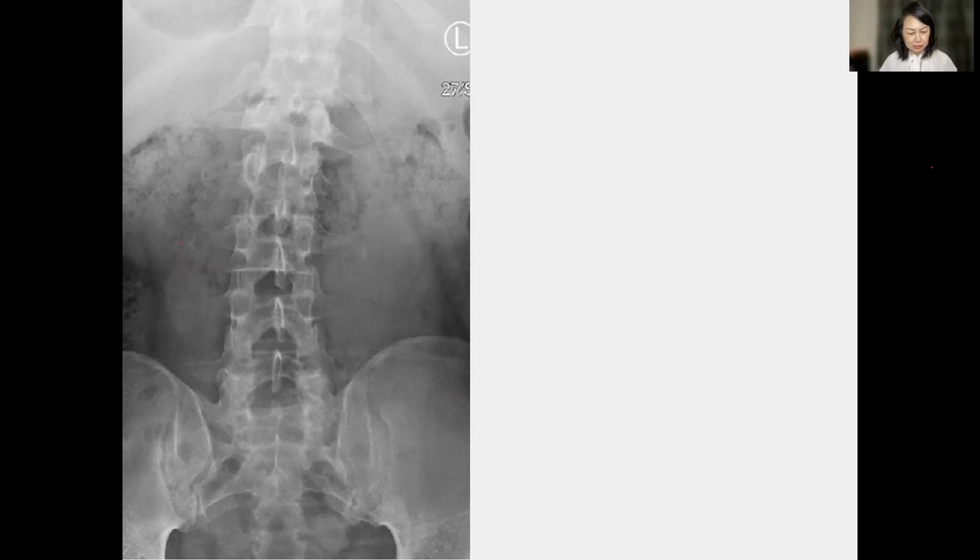Funny, no one on Facebook is answering. It's live on Facebook as well. Large bowel obstruction? No, large bowel obstruction would occur at the periphery, but I already coned the image, so it's not. Review area for abdomen X-ray.